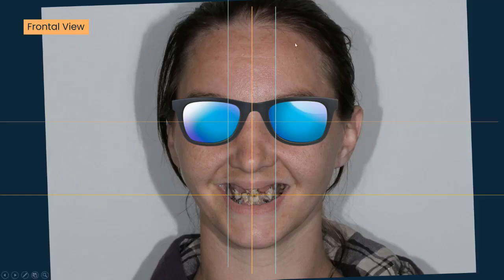But one of the things is this slide. A vertical line, you're going to pull your picture in and align it behind that line so that it's going through the facial midline. Then it's got a perpendicular line, so this horizontal is what you would adjust up or down to go through her pupils. Actually, I should say leave the template lines where they are and then spin your picture around behind that until you align.